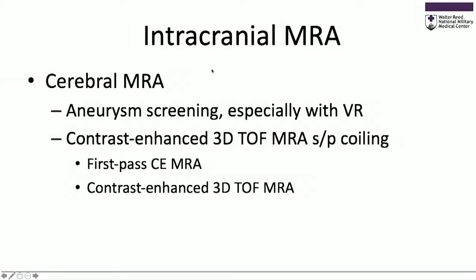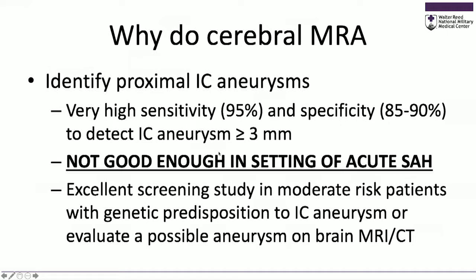MRA, how do we use it? Clinically, we use it every day for aneurysm screening, and I'll go over especially more advanced post-processing with volume rendering. We also use it to evaluate patients who have had aneurysms treated clinically. So the first thing is just finding the aneurysms, identifying proximal intracranial artery aneurysms.